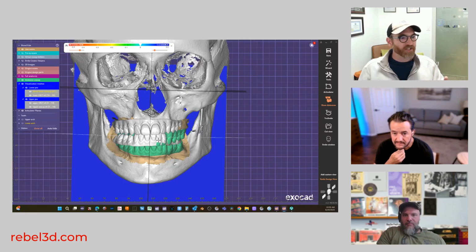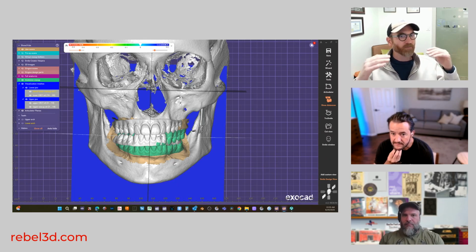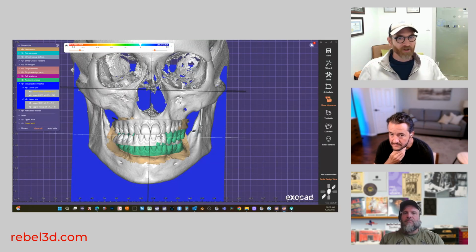Smile design and facially generated treatment planning is all based on how you mount the upper to a photo. It's all about the maxilla and the photo lining up. The lower jaw is going to be moving around. You just have to figure out how to interdigitate those accurately. But the aesthetics all come from mounting the teeth to the maxilla, and then mounting those properly so you can look at the face correctly.